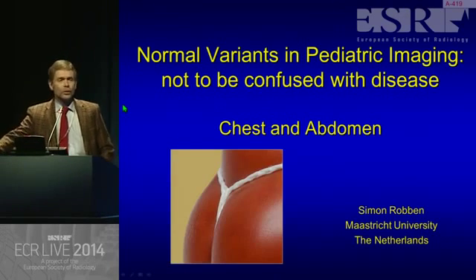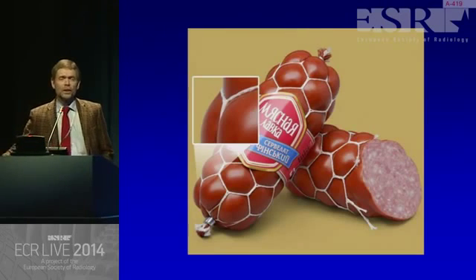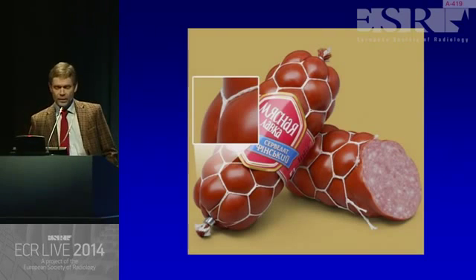So sometimes your first impression is wrong, because it looks like this. And that's what this lecture is all about, seeing things differently. And I'll show more of these kinds of eye teasers to keep you awake.